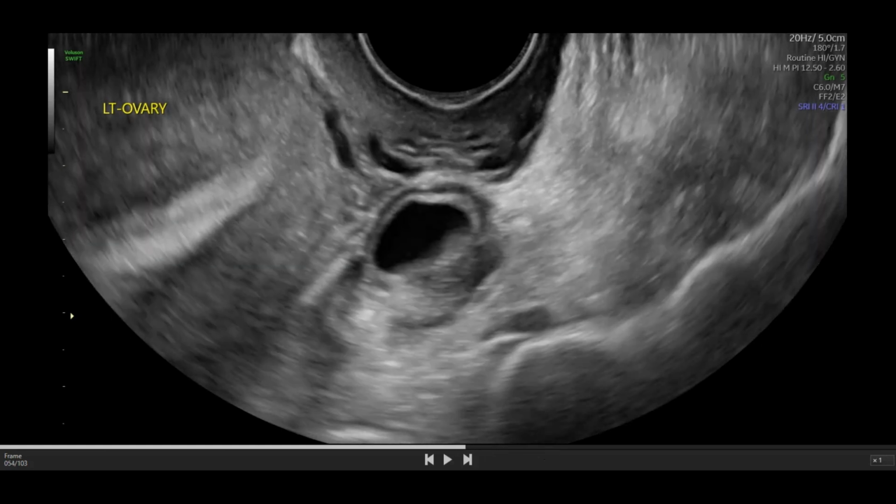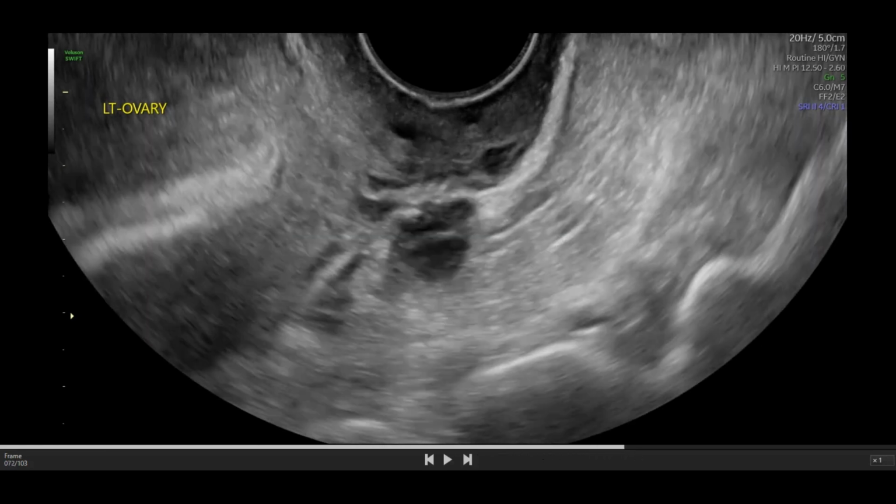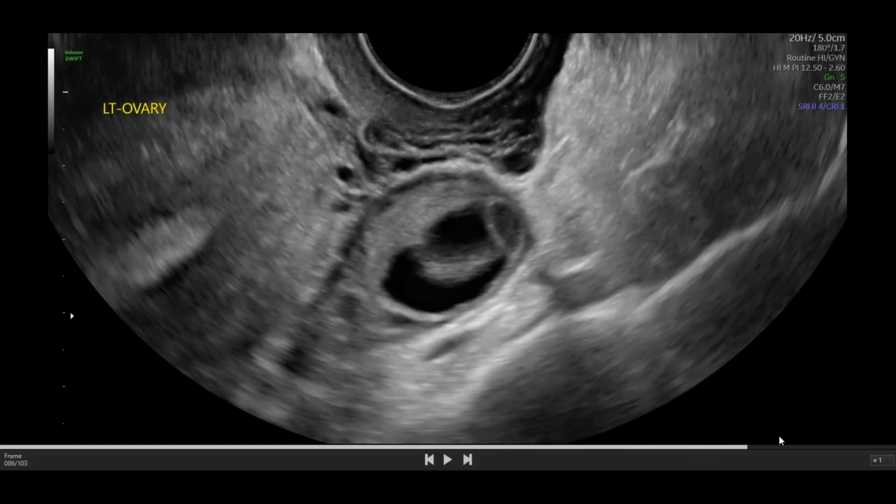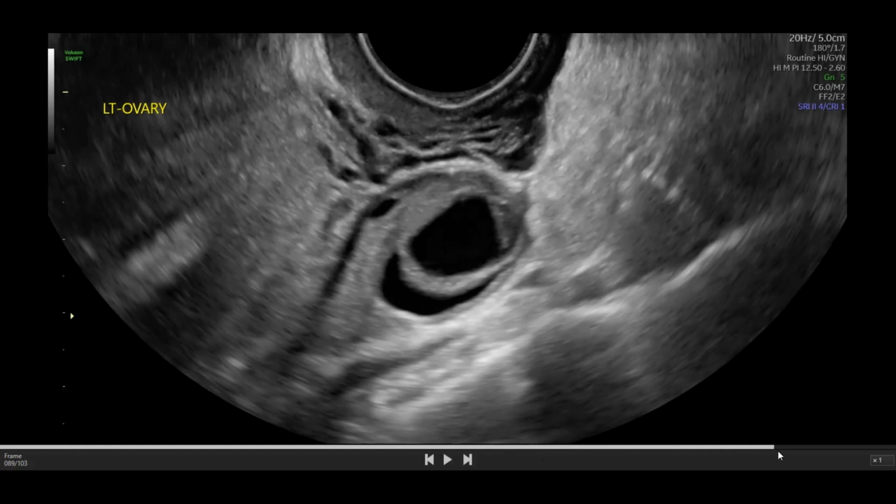So maybe what we're seeing is just normal. And we see them in different amounts in different people at different life stages. But this is one of those features that we should probably try to understand a little bit better, so that way we're understanding what's normal and what's not normal.